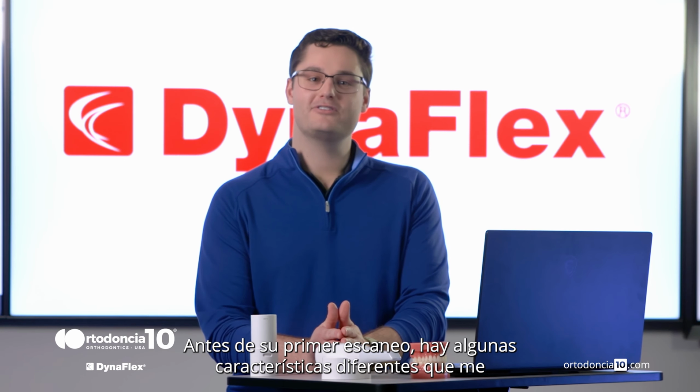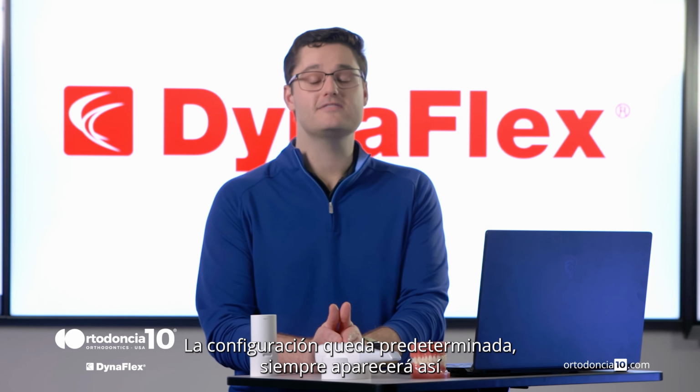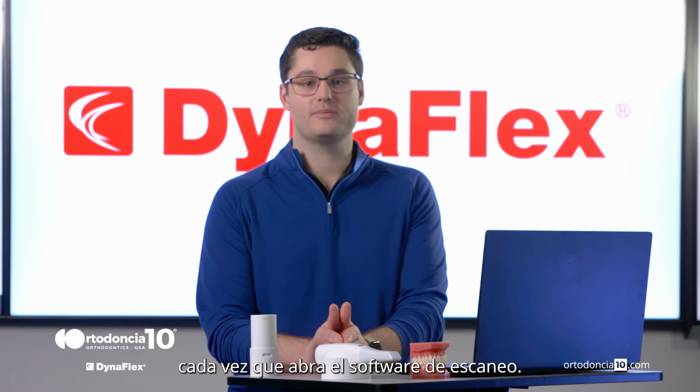Before your first scan, there are a few different features I'd like to go over. Once those features are applied once, the setting is defaulted and will always go to that every time you open up the scanning software.